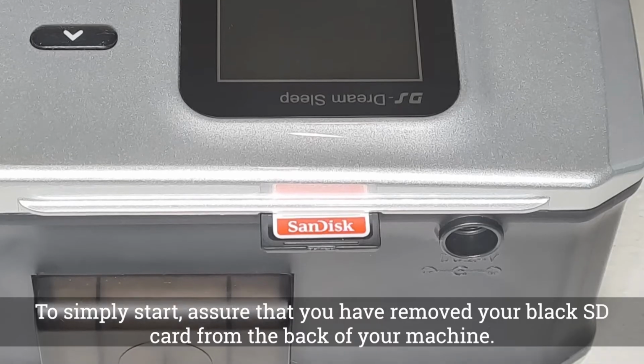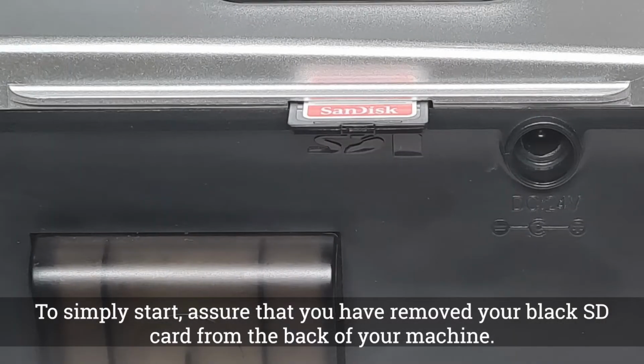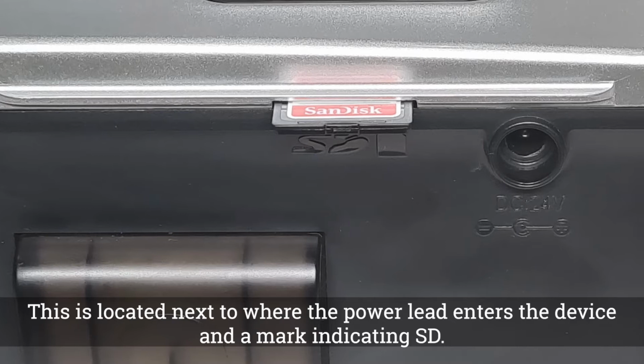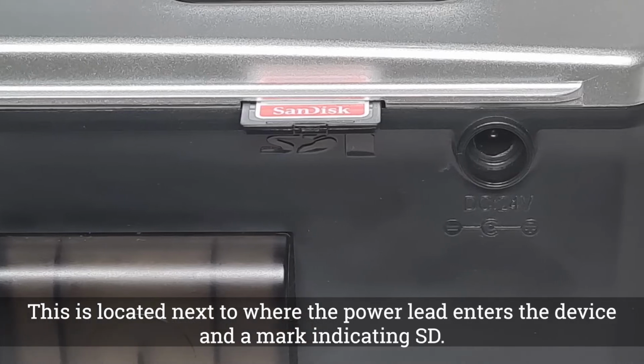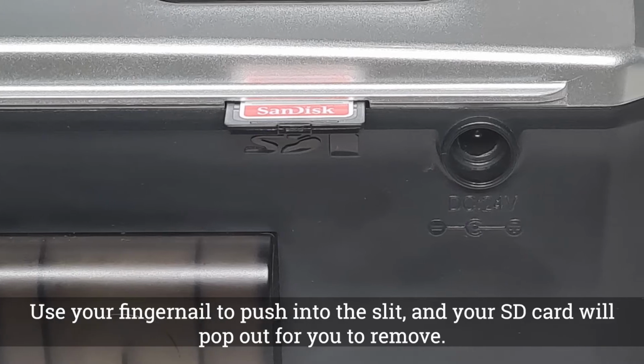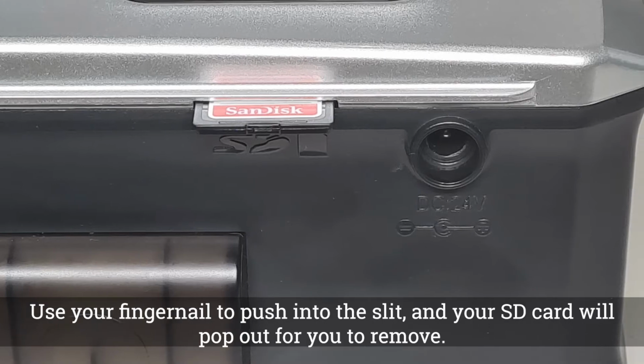To simply start, assure that you have removed your black SD card from the back of your machine. This is located next to where the power lead enters the device and a mark indicating SD. Use your fingernail to push into the slit and your SD card will pop out for you to remove.